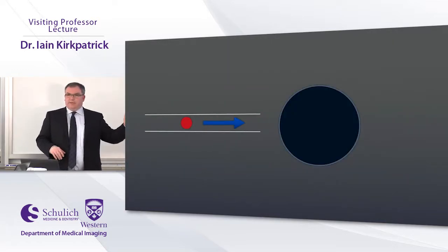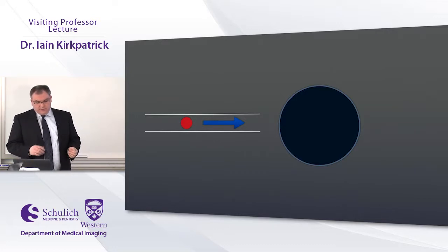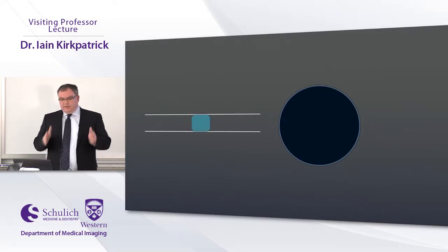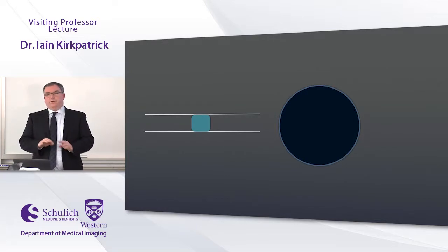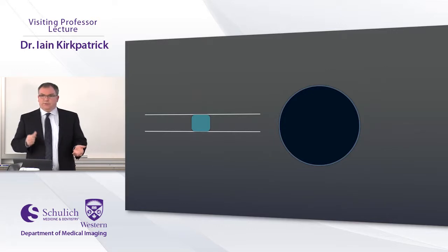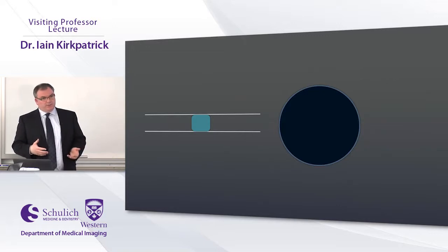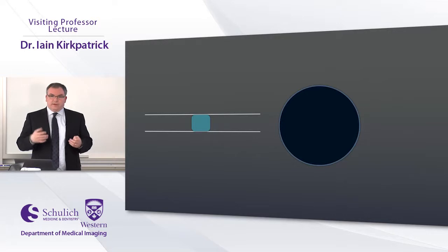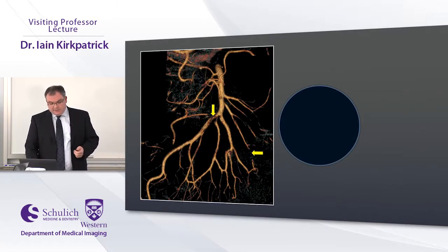We're going to go back to the beginning now and then interleave our imaging findings and see where they fit in. So first of all, arterial inflow ischemia. The first thing we will see before there are any bowel changes are CT angiographic abnormalities. So we'll see the embolus, we'll see the thrombus, or we'll see CTA signs of non-occlusive ischemia, and the bowel can look completely normal. I stress this because looking at the CTA is really an important part of assessing these cases. Here you can see there's some emboli in the SMA arcade.